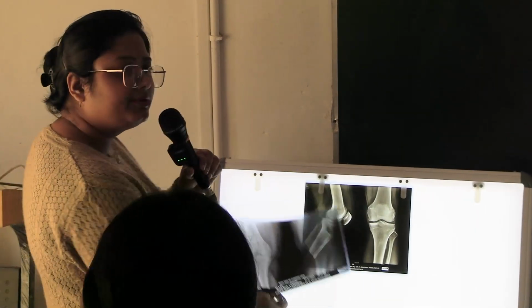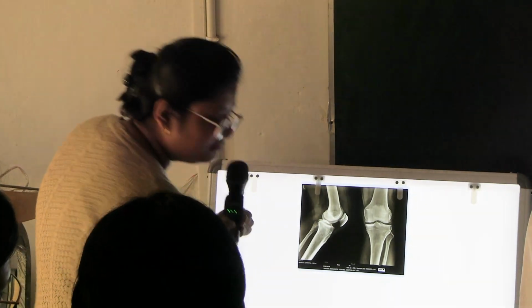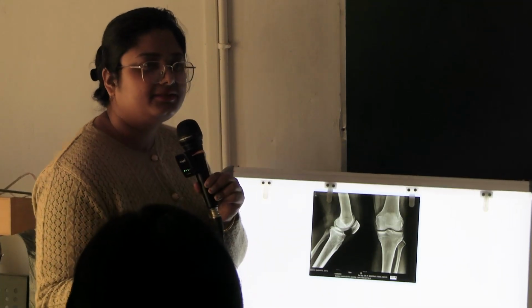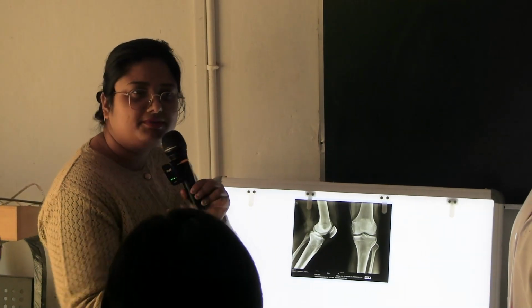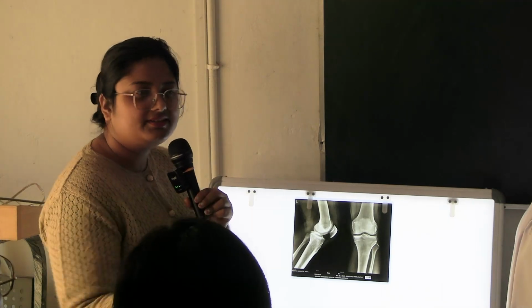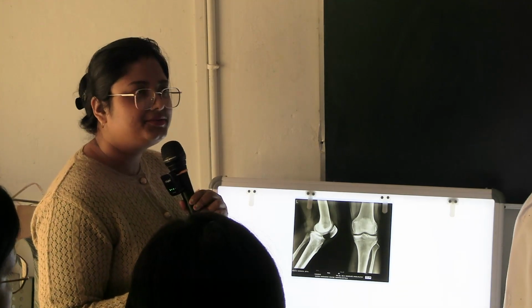Understood. Okay, so that's all the X-rays we have for the lower limb in our department. So you have to identify and write down the related question. And in OSPE, you must be given one X-ray plate. That may be from different areas, maybe from upper extremity, maybe from lower extremity, maybe from thorax. All classes you have done, radiology is complete for 3 parts. Understood? Any queries?